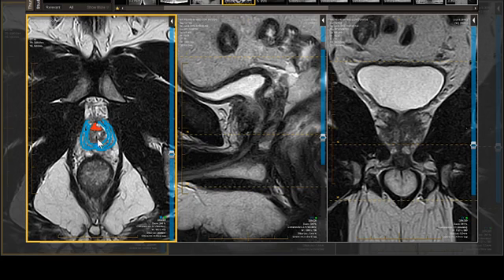And we're starting to see a little urethral opening again. So this would be the apex of the prostate. So if we had a cancer, say right here, we would say it's in the apical right PZA, or anterior aspect of the right peripheral zone. And we would look to see if it grew into the fibromuscular stroma, grew in front of the fibromuscular stroma, going into the preprostatic space of Retzius, going through the capsule, etc.